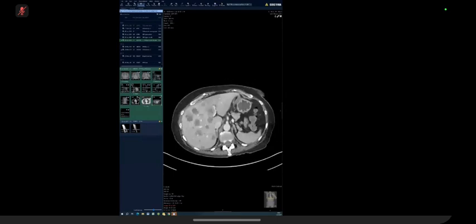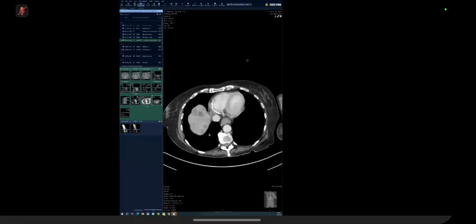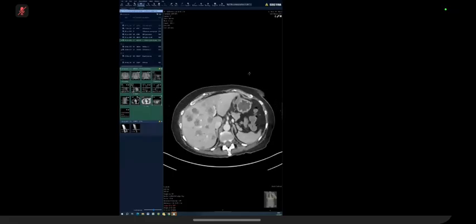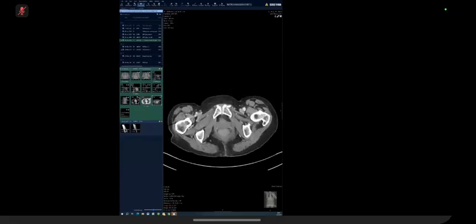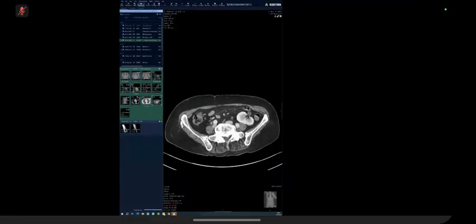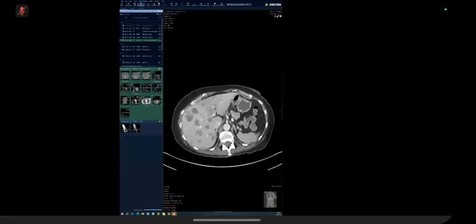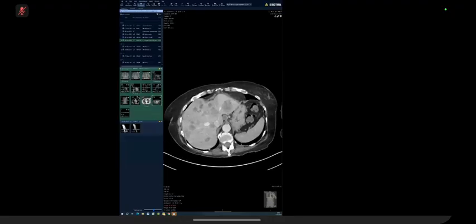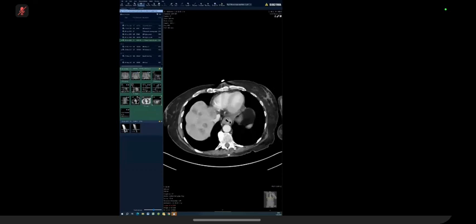They're not going to give you a liver lesion only scan. They want you to find the primary, and they want you to have a systemic way of thinking. So when you have liver lesions, but the lungs are normal, you're automatically, rightfully thinking GI tract. So you said colon, but unless it's a CTC, they're not going to make you look for a very tiny circumferential bowel thickening on a CT. It would be something more obvious. You picked the liver lesion. You did not talk about the necrotic looking nodes that were right next to it, and that's one. That's two.